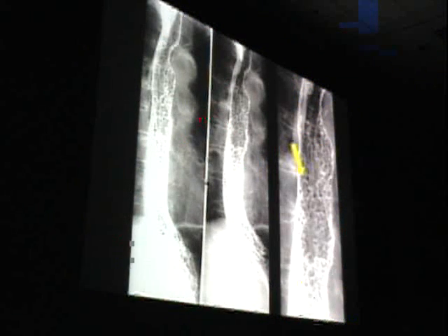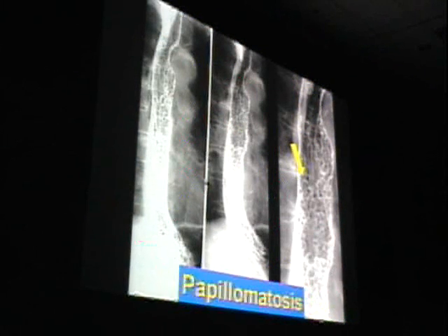This is a very unusual case. This is squamous papillomatosis, and I might show this case on the boards to get an understanding of what you all have in terms of differences for little nodules like this in the esophagus. And so this is a differential diagnosis of multiple small nodules in the esophagus, and there are a variety of things that can do this.